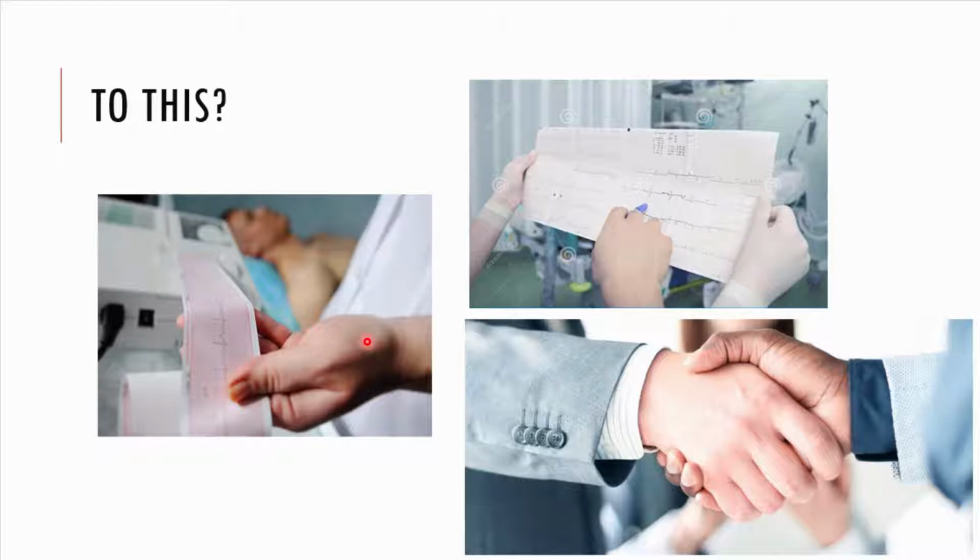Remember, in the previous lecture, we divided the heart according to the rhythm problems, as the rhythm could arise from the SA node, it could arise from a focus in the atrium, it could arise from a focus that is very near the AV node. So you collectively refer to those as supraventricular rhythms, or it could arise from the ventricle. You refer to that as a ventricular rhythm. The rule of thumb on the ECG is that if the rhythm is arising above the ventricles and there's nothing wrong with the conduction system in the ventricles, you're usually going to get a normal QRS complex or a narrow QRS complex. If the rhythm is actually being generated from the ventricles, then you get a broad QRS complex.